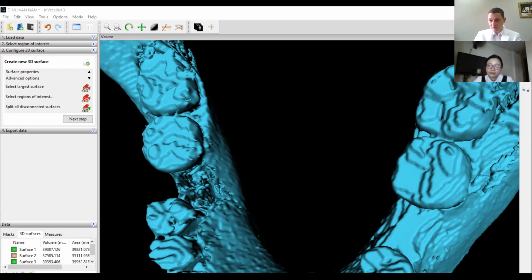This is your jaw. If you want me to bring back the anterior teeth, I need to remove something. If I remove this one, I cannot bring back this one. So I have to extract either this one or a premolar. And you can show that to your patient.